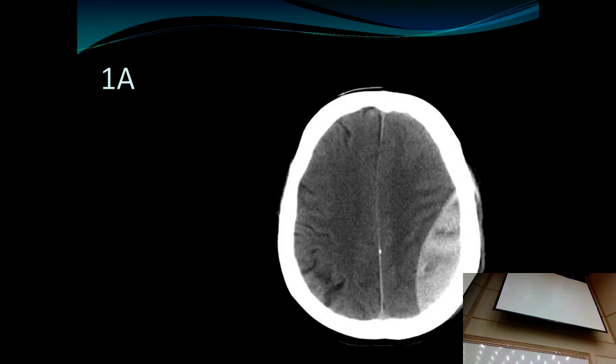And really in a young individual, epidural hematoma is more likely. As you get older, the dura becomes more adherent to the skull, and so we don't see epidural hematomas in the elderly that much. Children with head trauma, young adults with head trauma, epidural is more likely. Okay, and notice it's bright. So acute hemorrhage looks bright on a CT. So this is an acute hemorrhage, and it's in the right location, right? Because this is Wernicke's area, right back in here.